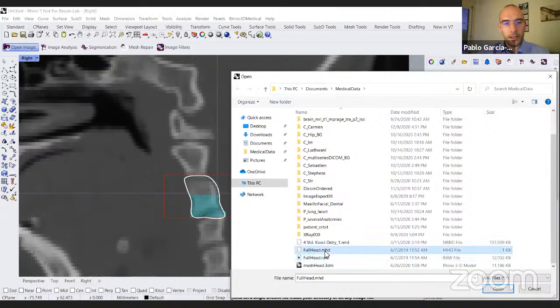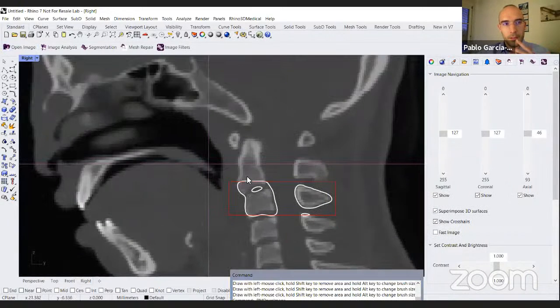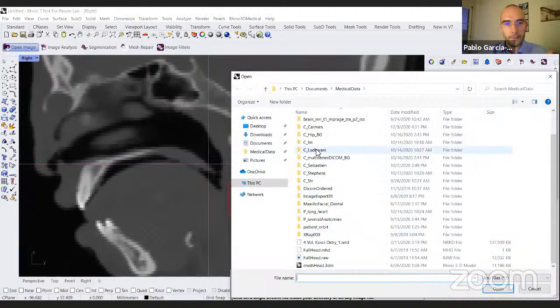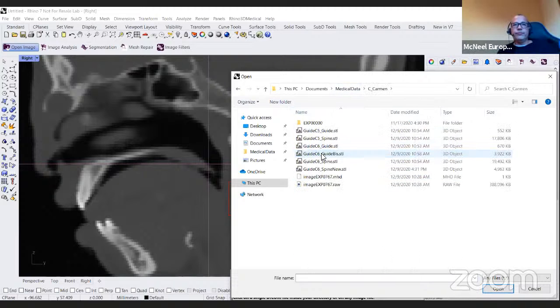So you should have an MHD associated with your image, and then we can open that. And then DICOM, metadata, any kind of things. So NIfTI, DICOM, metadata, and NRRD. All the file formats you support are specified, yeah, they are specified.